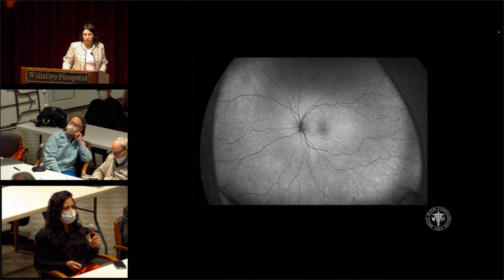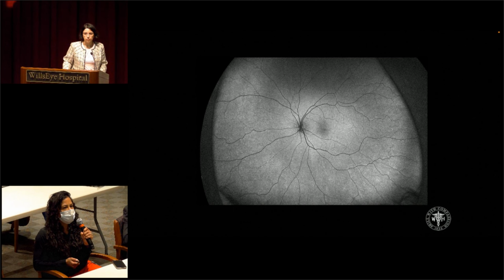Yeah, in the left eye, overall normal hyper and hypoautofluorescent pattern of the posterior pole. Just looking at that area where we saw that nevus, I believe it was around here. And we see some punctate scattered hyperfluorescent spots correlating to the drusen.